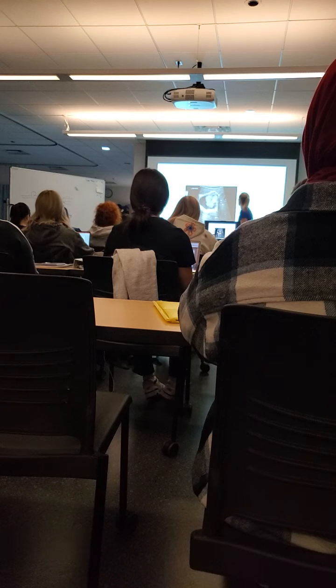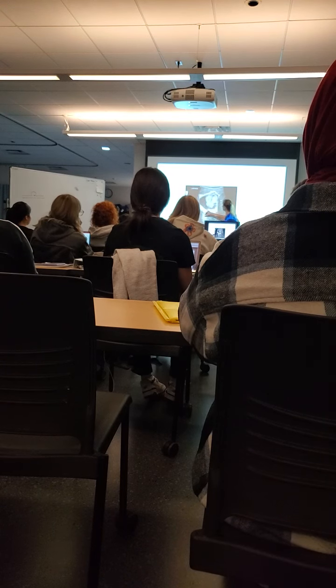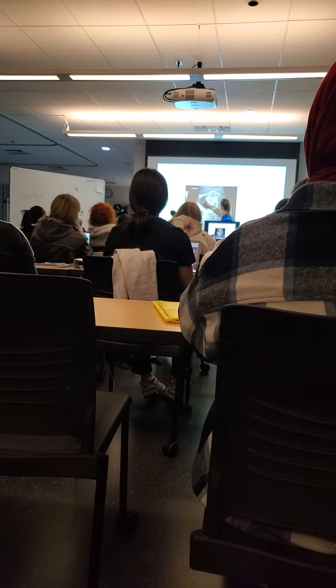And then if we have an area of gallbladder wall thickening where this attaches, we're going to say, is this malignant? We're going to investigate for malignancy. Okay, here's the fundus, fixed to the wall, non-shadowing. And this is also sludge filled. There's a little bit of sludge in this gallbladder as well. Maybe a little bit of normal bile up here, but here's that adenoma. And you can see he's larger, so he's inhomogeneous. He's starting to outgrow that blood supply. So he's getting a little bit necrotic.